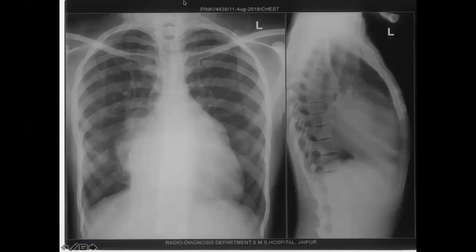Sometimes they may ask you this. So this is another X-ray. What you can see here, you can have one cardiac border here, another cardiac border. This cardiac border is continuous with the right side. This cardiac border is appearing beyond this. So this is basically a grade 3 case of left atrial enlargement. Then again, the left atrial appendage also appears enlarged posteriorly here.